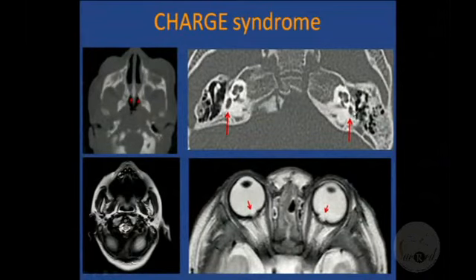You can actually see these colobomas on the CT also if you pay attention and get a proper reconstruction. So you're making the diagnosis. They send it for choanal atresia, but you send it back with the complete CHARGE association. Or you can even say there are no features to suggest CHARGE. That is also a significant finding, right? So that's what you need to say.